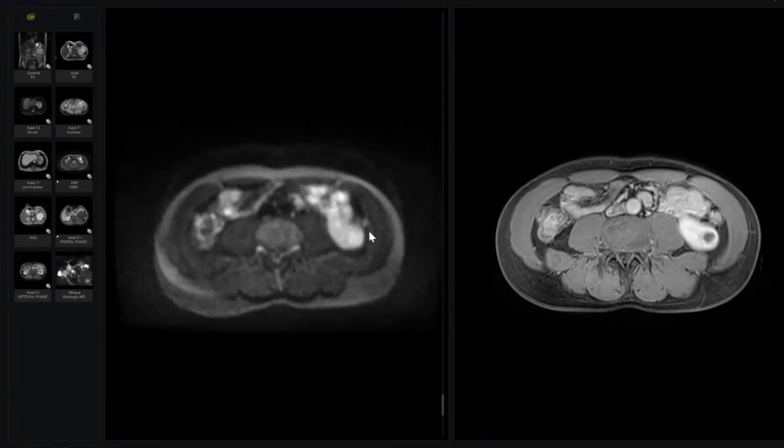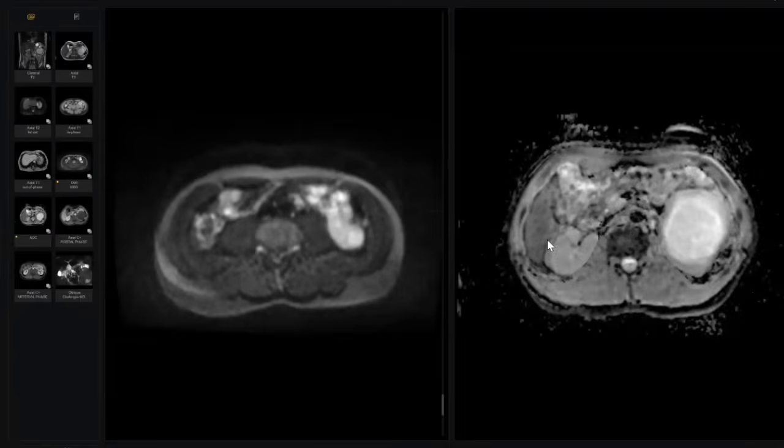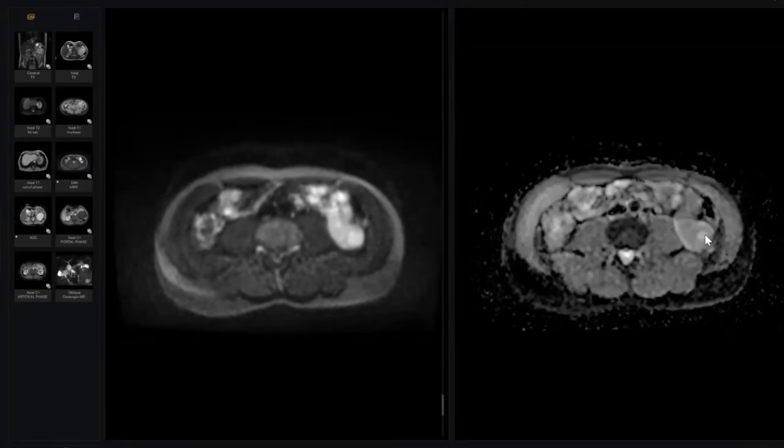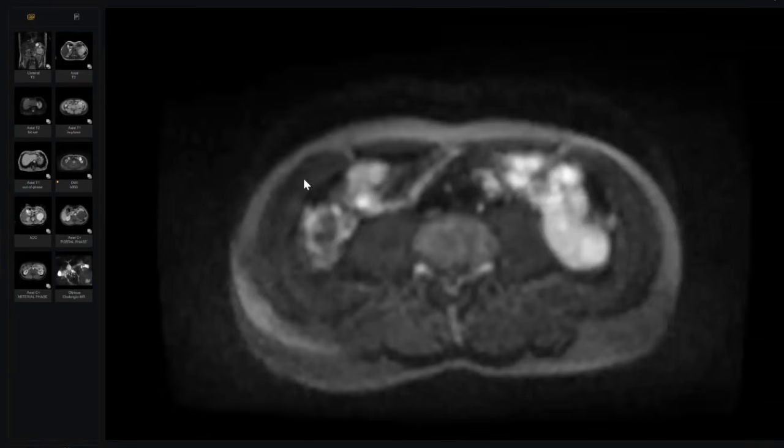See, there is restricted diffusion, which you can prove by the ADC. And what else? Look here. At least look here, doctor. The periphery is restricted. The center is cyst. Okay, acceptable. So there is a peripheral solid component or mural thickness. What else?